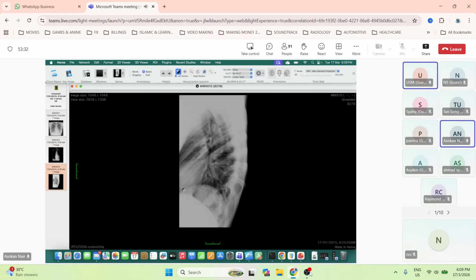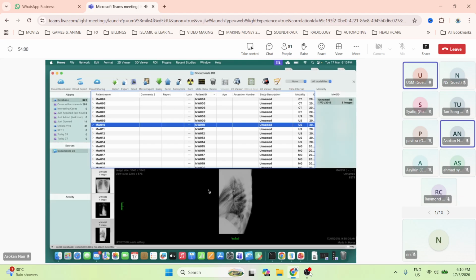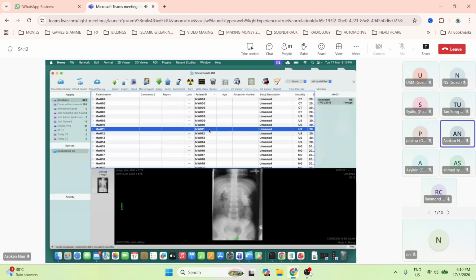So the plain X-ray tells you it is from the vertebral body, right? So again, there's a compression fracture causing the gibbous. Okay, when you say the word gibbous, you're thinking of TB. Yes, okay, right? So this is how you describe these things. Okay, now you want to say you want an MRI, okay? So I don't have an MRI, but this turned out to be TB with a tuberculous abscess, right? Okay. So again, posterior mediastinal masses, another cause of it, all right?